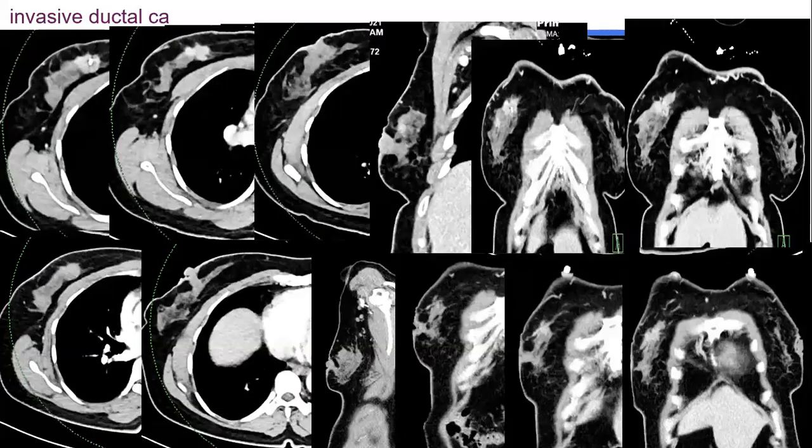And this is very essential. The miss is not only on mammography. This lady, before presenting with breast abnormality, had a CT chest for another reason, and the mass was there, but not reported. Look at the lesion, the first row here.